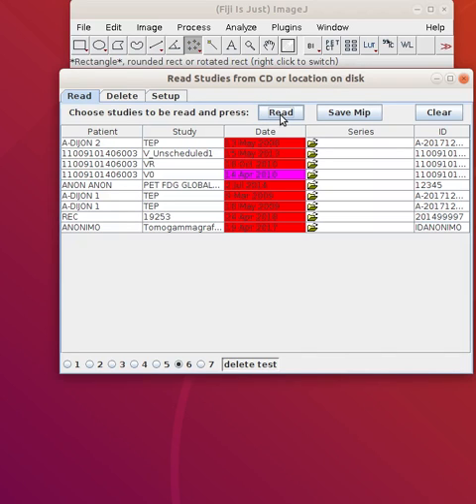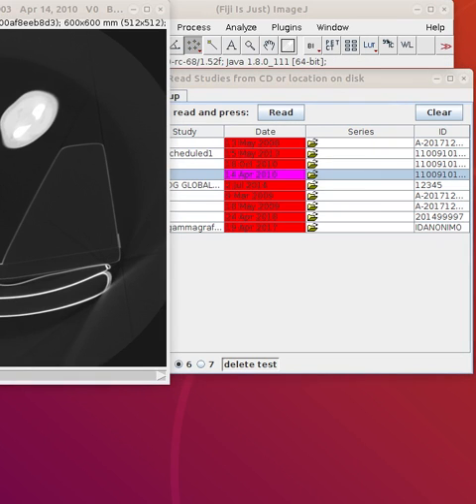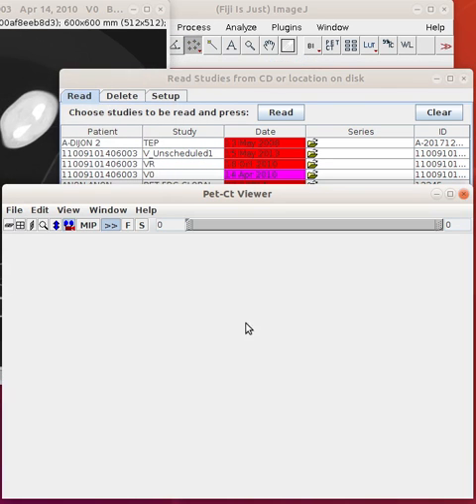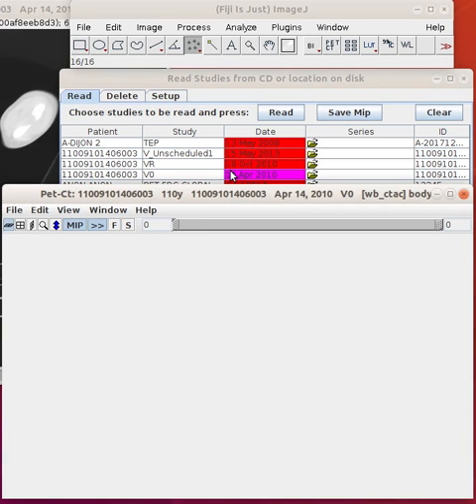This is an auto-segmentation demo. The first thing to do is bring up a study. This is a fairly difficult study to show possible problems. You can see from the color coding that it actually has a previous analysis, which I will ignore.